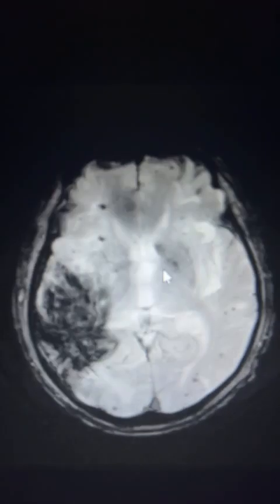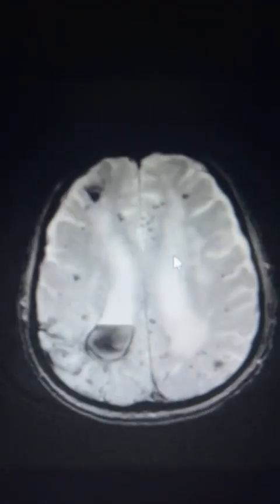The other observation is that we did not see a corresponding abnormality on the CT scan. So if this were to be calcium, you'd expect to see these as calcified foci on the CT scan, which was not the case. So you know that these are areas of tiny chronic hemosiderin from hemorrhagic foci that are old and small to the extent that you could not see them on a CT scan, but they are exaggerated on such acquisition. Now, we confirmed that these foci are chronic areas of hemosiderin deposition from hemorrhage.